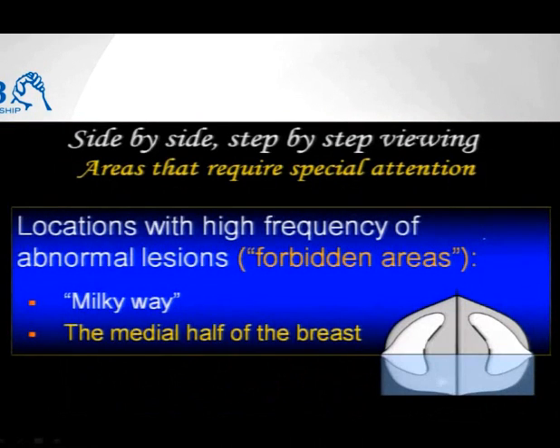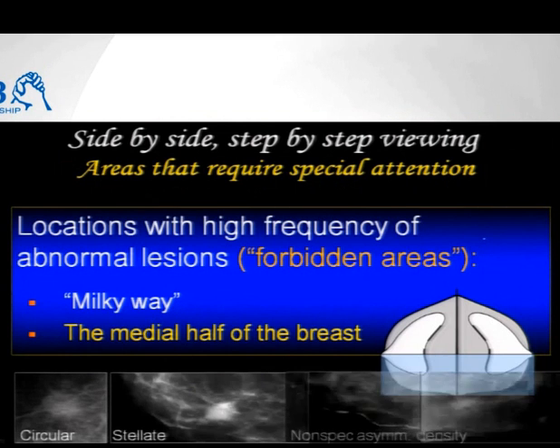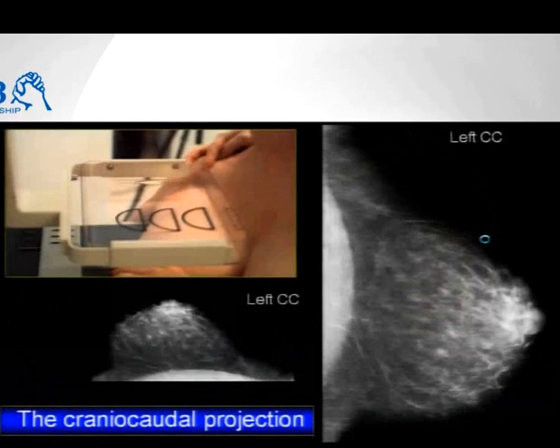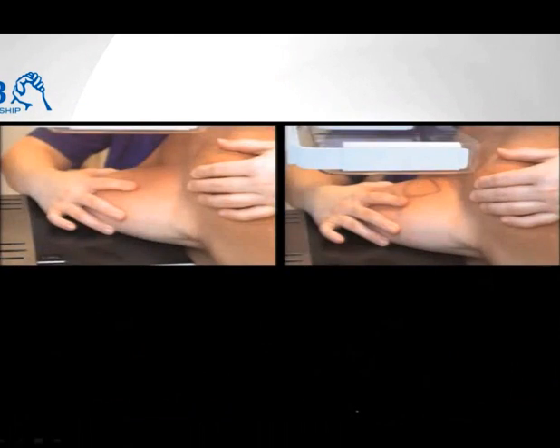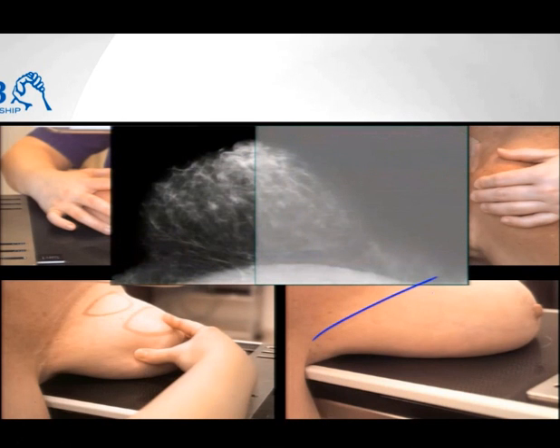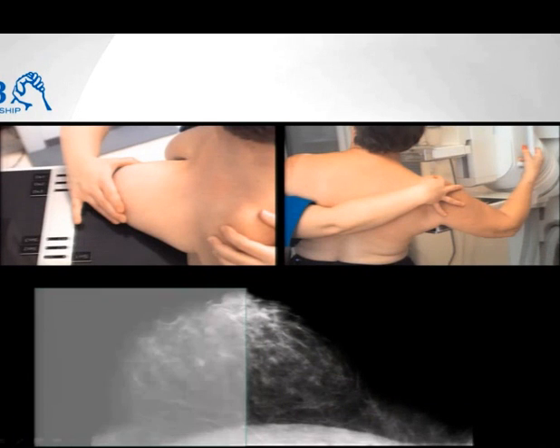A few more minutes, medial half of the breast. That's where we are looking for these densities and stellate lesions. Again, the positioning is extremely important. While we know that 70% of the cancers are in the lateral half, we might just lose the medial half and the cancer within. And we shouldn't. Quite an art again. They should drop the shoulder and include both the medial half as well as the lateral half. The medial half is going to have about 30% of the cancers.